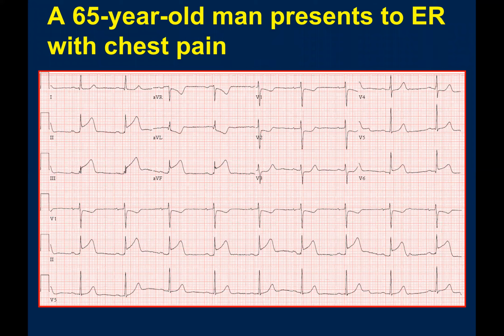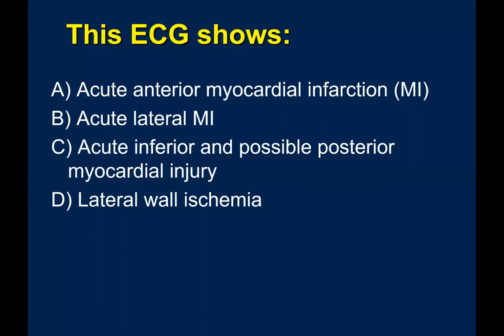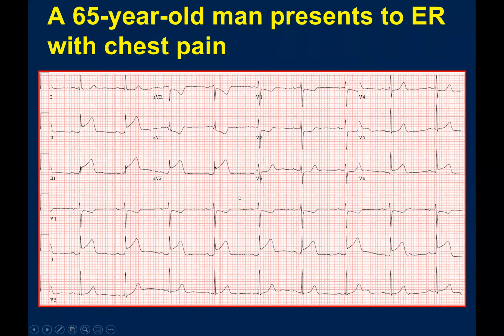Okay, excellent. You got the diagnosis right. But if I ask you now, is this patient in sinus rhythm or atrial fibrillation? It looks sinus because there is a P wave before every QRS. And is there any problem with the conduction system? Can I see the ECG again, please? That's the only reason I moved it. Clinically you are excellent, you're doing a great job, but also be systematic, so you will not miss important things.